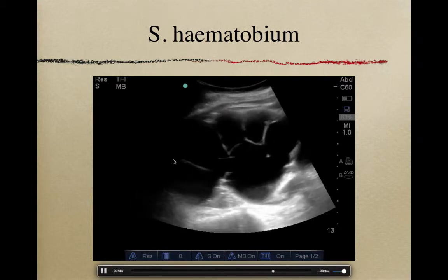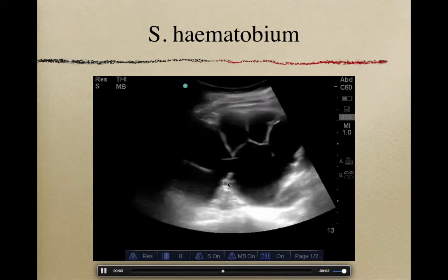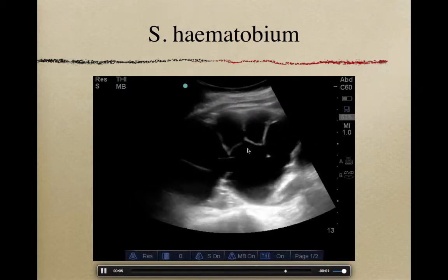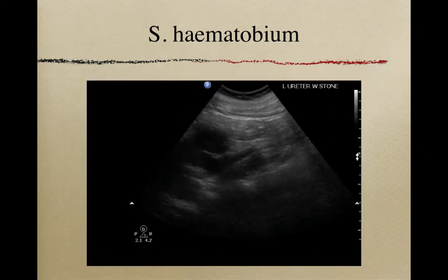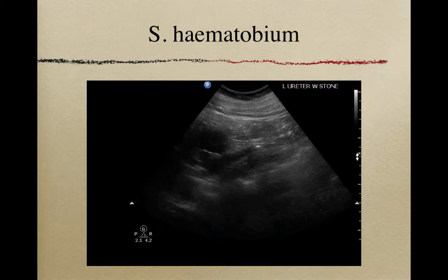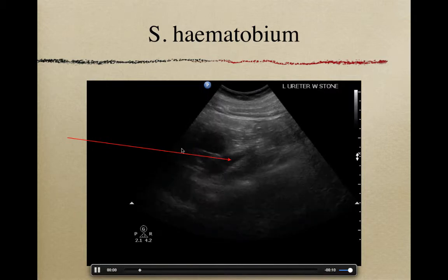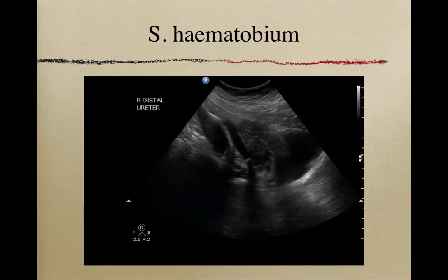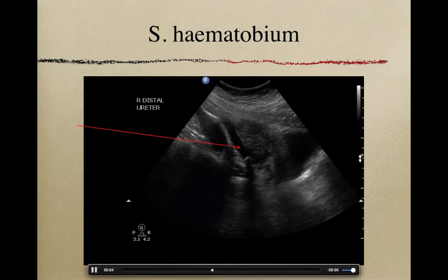The fascia of the kidney you can still kind of make out surrounding it here, but the rest of the kidney is almost completely obscured by the large amount of hydronephrosis which you see here. The ureters also can be dilated. In this case, this is a proximal ureter that's dilated. It's kind of hard to pick out without the arrow, but here's that proximal ureter that's dilated, and we can see the kidney here. This is a distal ureter that's dilated, in this case right here.